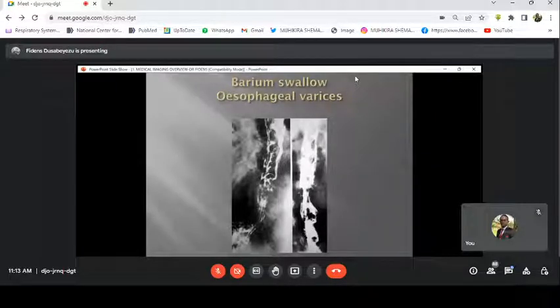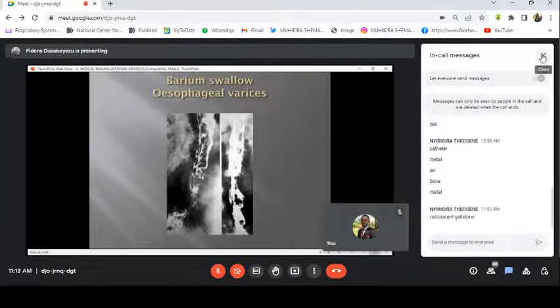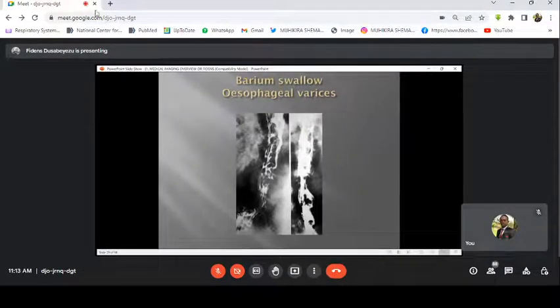So me as a radiologist, when I see this immediately, I know there are some esophageal varices. Not only esophageal varices, you can diagnose any ulcer, any esophagitis, any reflux, any tumor, esophageal cancer, diverticulum, you can see it. So you can diagnose different diseases from this examination. All right. I have just given you an example to show that fluoroscopy, in real-time examination, can diagnose different diseases.